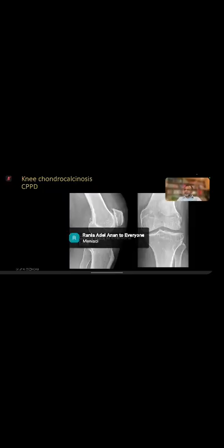So we looked at the previous imaging, and this is the previous imaging. Can you see any calcification? Yeah, calcification there. Faint calcification in the cartilage as well. Very faint, but definitely the posterior meniscus is calcified, which is a fibrocartilage. Maybe some calcification in the synovium, okay? I know sometimes it doesn't project very well, but I'm sure you can see some calcification there. So you can look around somewhere and confirm that there's calcification in the body. You don't have to do anything, just confirm that this is CPPD.